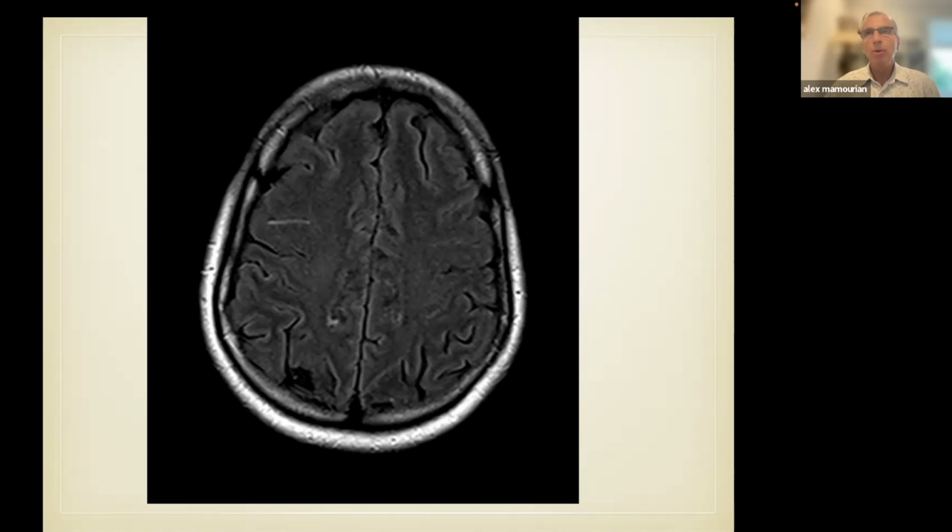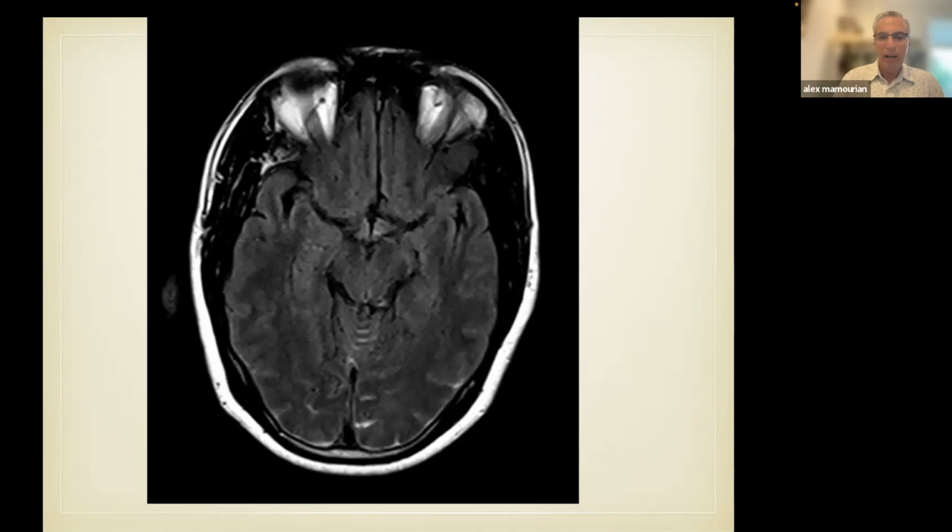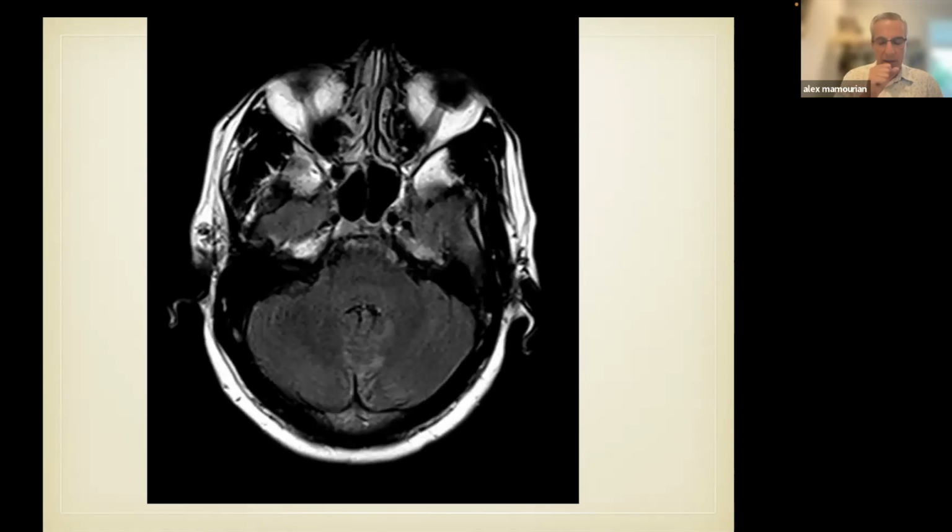Okay, I don't know if this is a good example. The problem with FLAIR, one of the hospitals I worked at, they use that algorithm. Negative CT, suggestive history, they were doing FLAIR scans. Here's the problem with using FLAIR scan. In many patients, and depending on how you do your FLAIR imaging and your scanner quality, there will be unsuppressed CSF in the pre-pontine cistern.